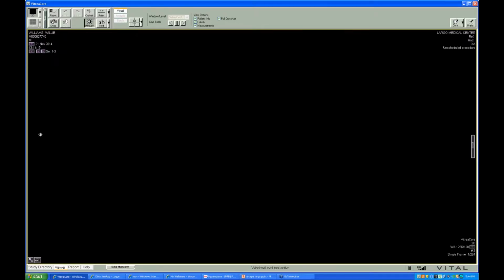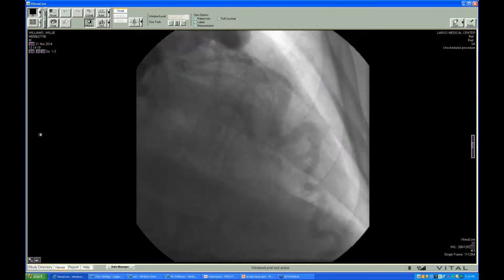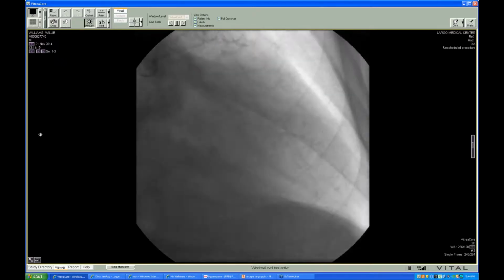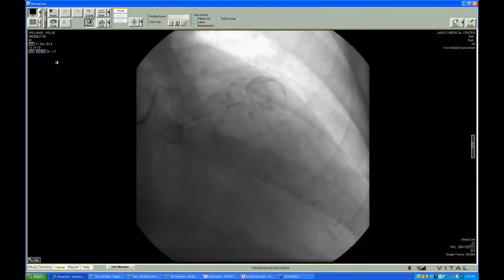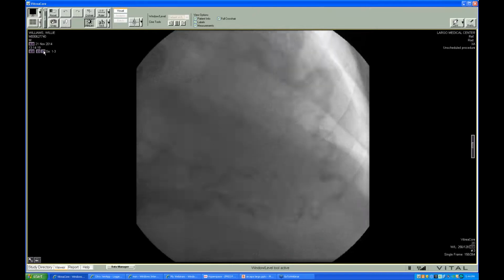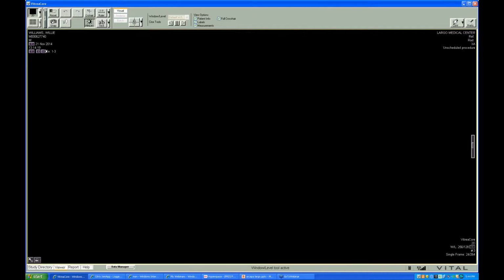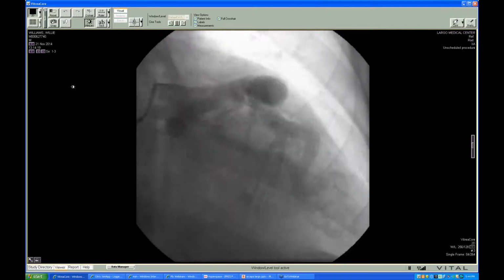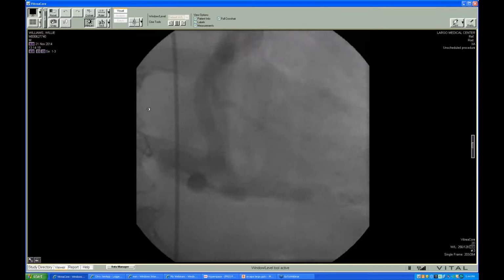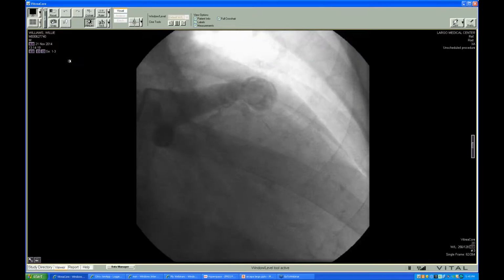They had a hard time distinguishing if it was a fistula to the PA, and after this, looked back at the pulmonary angiogram that they had gotten in the ER to verify that. Definitely, this is not going to the PA, but it must be going to a venous structure on the back of the heart, possibly the posterior cardiac vein or the coronary sinus. According to the CTA, they did see a connection of an anomalous RCA to the main PA.